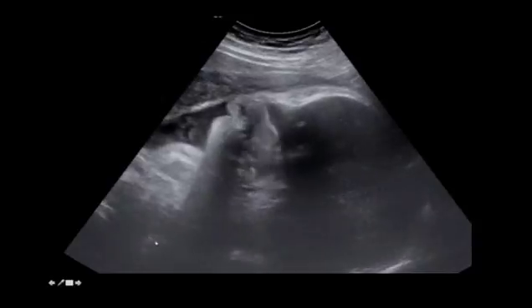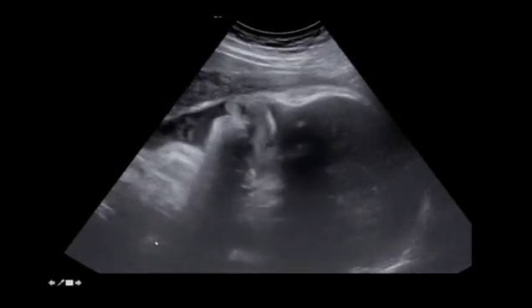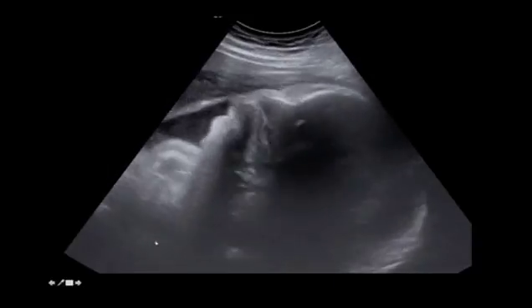Now here's another fetus that had a small chin and had a normal lip, as you can see, and normal incisor teeth buds. But as you go further back here, you can see that there is a hole in the maxilla. And one other way in which you can look at cleft palates would be in looking at where the tongue is, and here the tongue is actually up in the nose because there is no palate to hold it down.